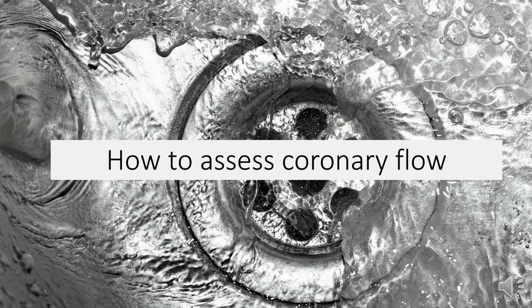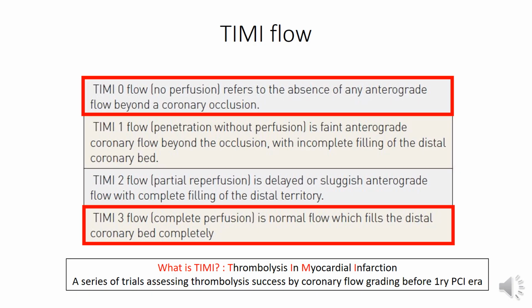The next step is how to assess coronary flow. We hear this term, the TIMI flow. So what is TIMI at first?